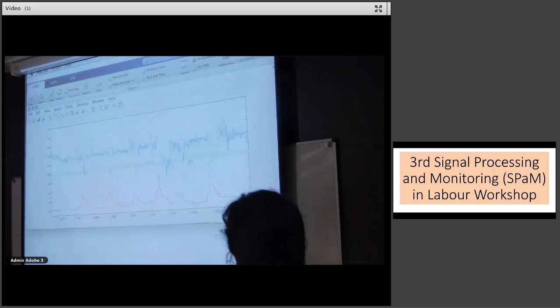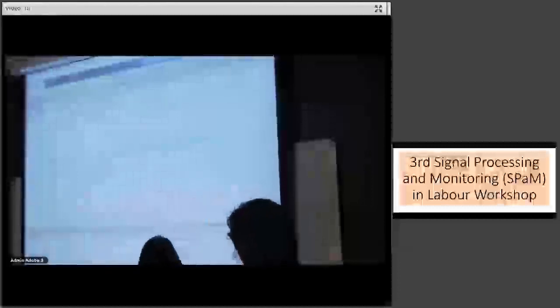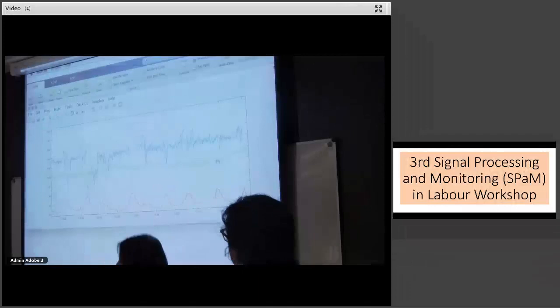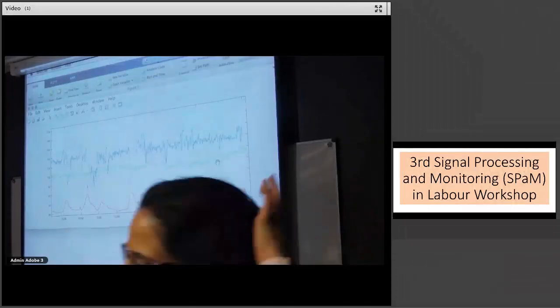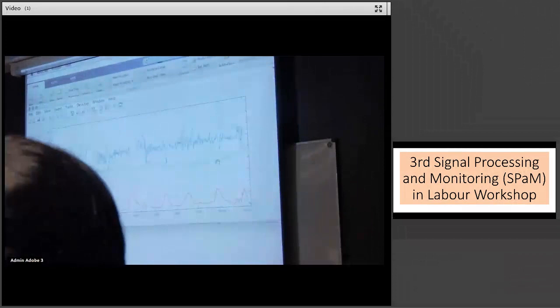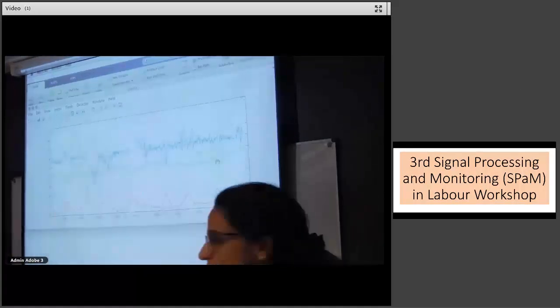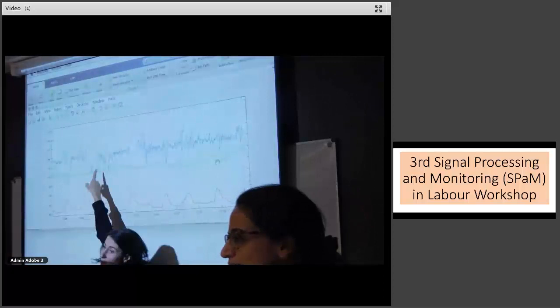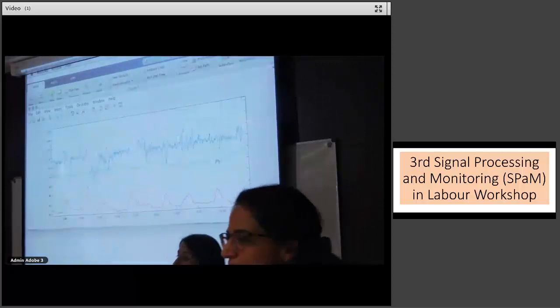Yeah. Okay. So here, what do you think? After this period of repetitive... So this is 3 minutes, 2 minutes, 3 minutes. Can I comment? This variable deceleration is different from the last one because this is three-wave type. There is acceleration and deceleration. Such a case is called compression.